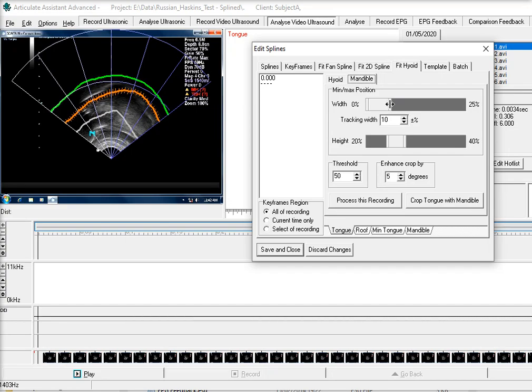Okay, I'm going to set the height. Now the height is between the base of the fan up to this 3/5 mark. So from about, I guess we want to go from about 20 to maybe about 50% here.